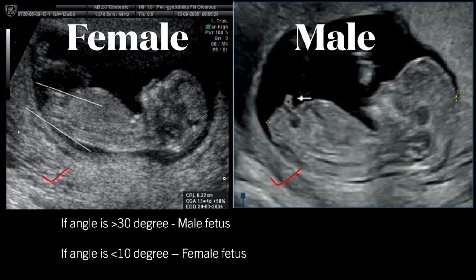How do we actually identify the fetal gender in first trimester? The simple answer to this question is by observing the direction of genital tubercle. In grayscale ultrasound, genital tubercle can be identified at the caudal part of the fetus. Here in this image, this is the fetal head and here is the fetal spine. Similarly, you can identify fetal head and spine in second image easily.